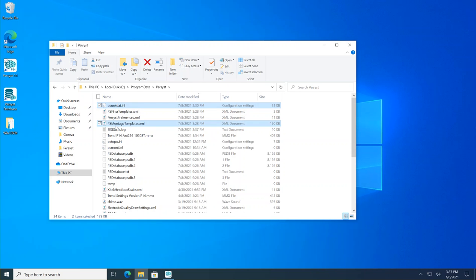Montage templates. This is that MMX file that I had. And PS Topo actually is for topographic mapping. And this one includes some 1010 maps. You may or may not use that, but it's included in that collection of files that I have for this.